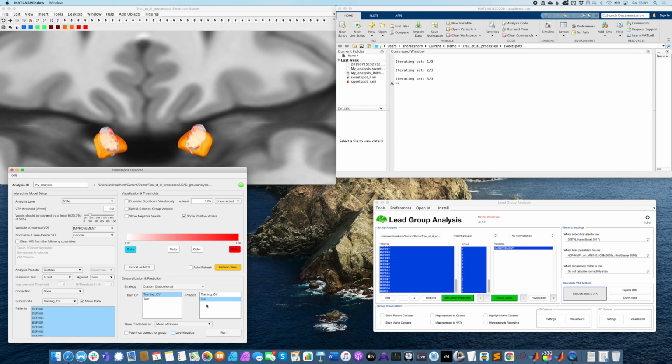Once we do this, we should not change the parameters anymore, because if not, we run the risk of overfitting our test cohort as well, right? And then this really becomes p-hacking, and you will always get a nice result, because you will play with the data so much and massage the data so much to find something significant. So once we press this button, we should not go back and change the parameters anymore. And if it fails, we should report that.